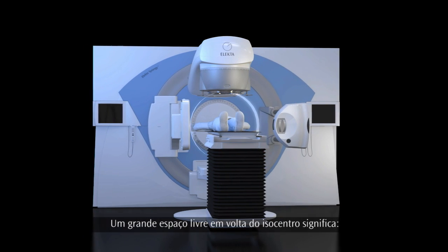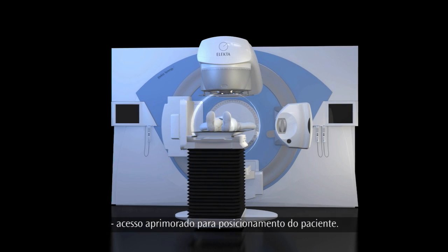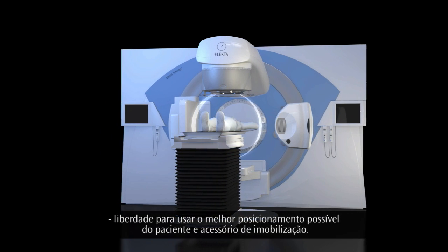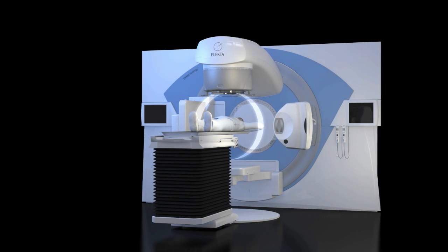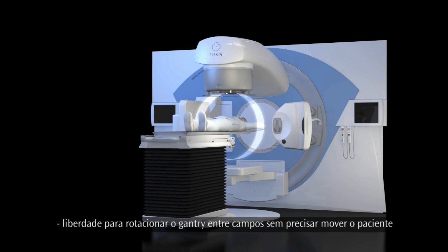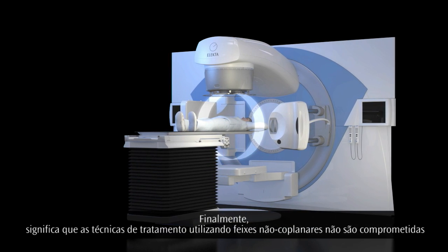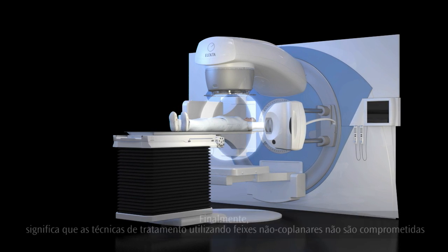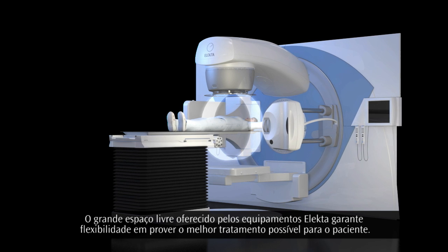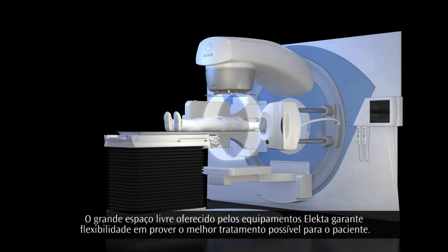A wide clearance around the isocenter means improved access for patient setup, freedom to use the best possible patient positioning and immobilization accessories, and freedom to rotate the gantry between fields without needing to move the patient. Finally, it means that treatment techniques using non-coplanar beams are not compromised. The large clearance offered by Elekta machines ensures flexibility in providing the best possible treatment for the patient.